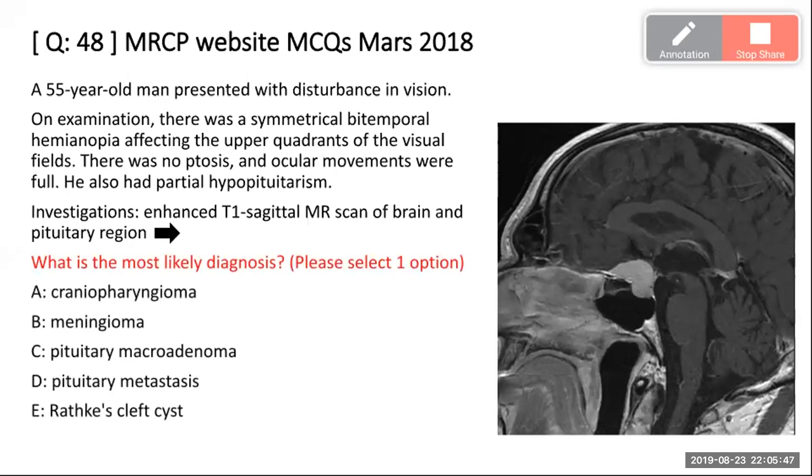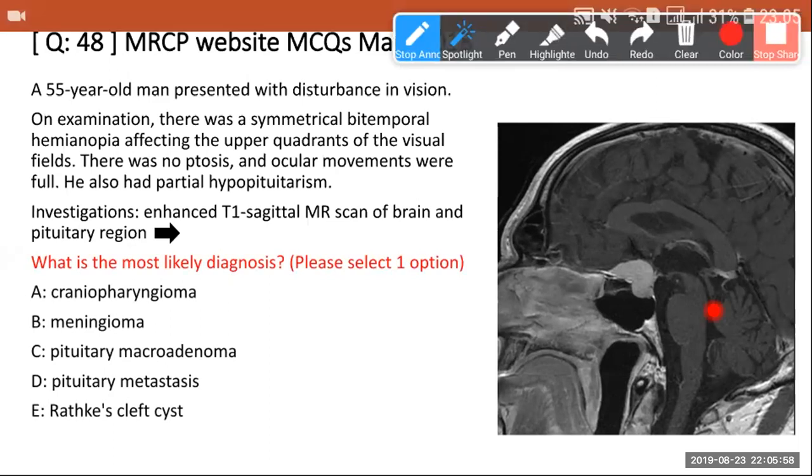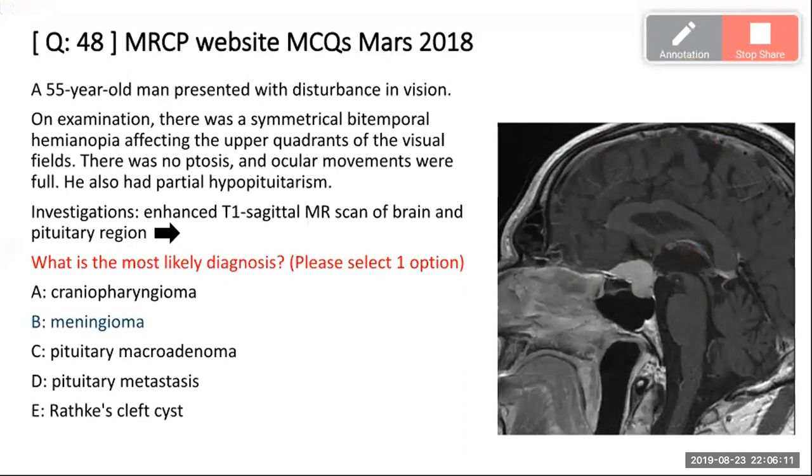Meningioma. This is a suprasellar mass with expansion to the sella. Yes, exactly, with a dural tail. This is the dura enhancing, and this is also a vessel, so it is with gadolinium. This is a homogeneous enhancement with a dural tail, so it is a meningioma. Yes. Okay. Thank you.